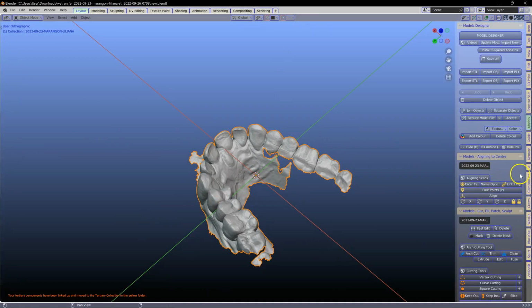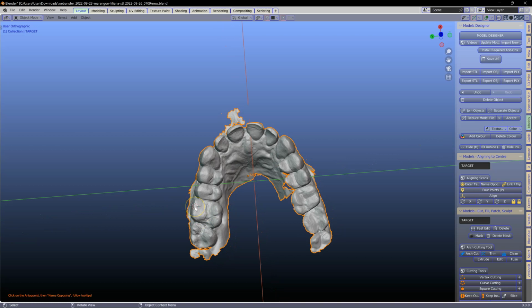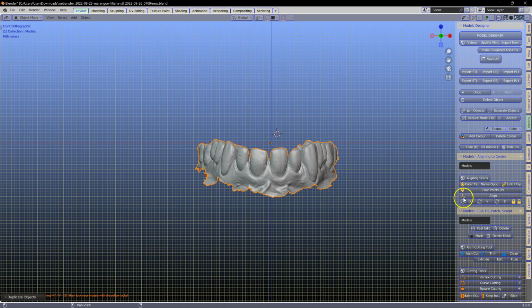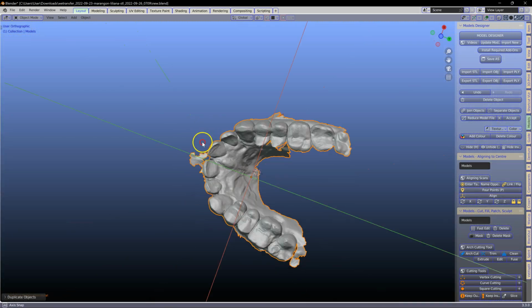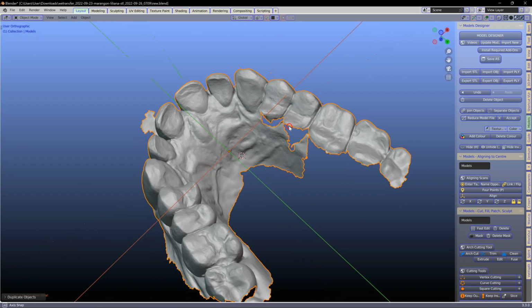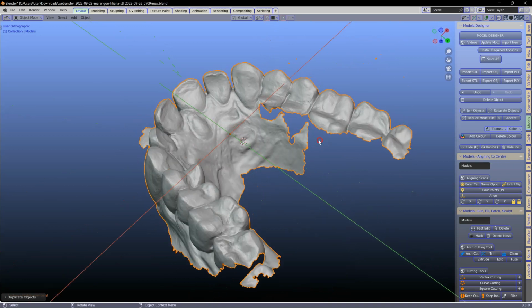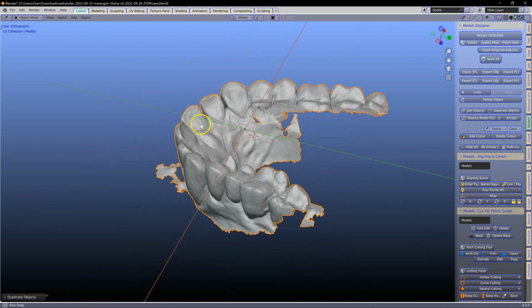Okay, so first thing we're going to do is put this to the center, enter, and like you usually do, we're going to add a few points and align that. Okay, I'm going to spin it around on the y-axis like that. Next we're going to make a nice model. I see you've only used a little bit of the model, which is good because all of this here is defective. Alright, so let us do exactly the same thing.